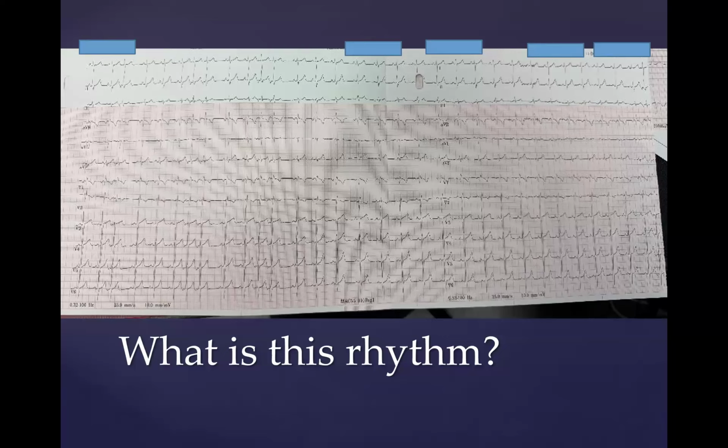Morning, Dr. Pass. Looking at this rhythm, just looking at the whole rhythm strip as a whole, it looks irregular. It looks like there's a P wave before every QRS, but the R to R interval does vary.